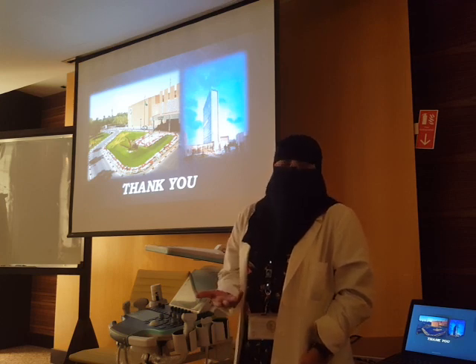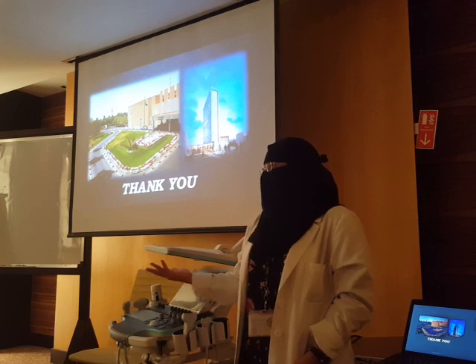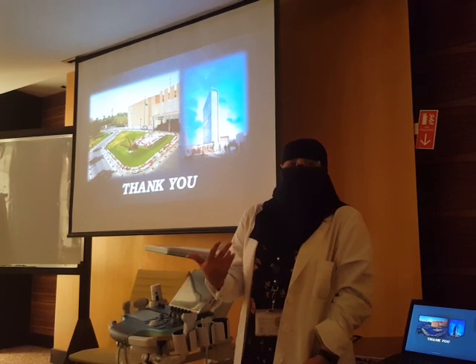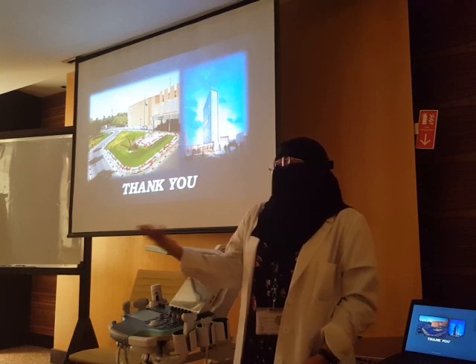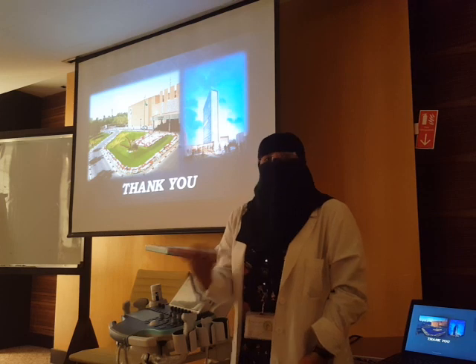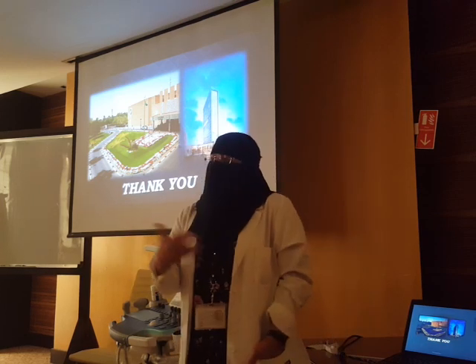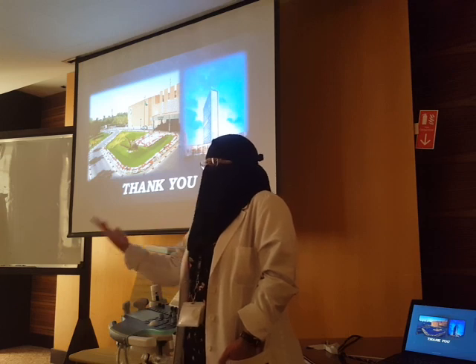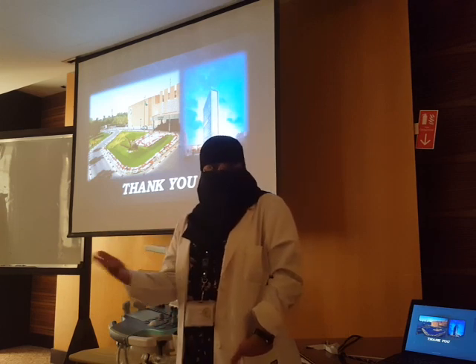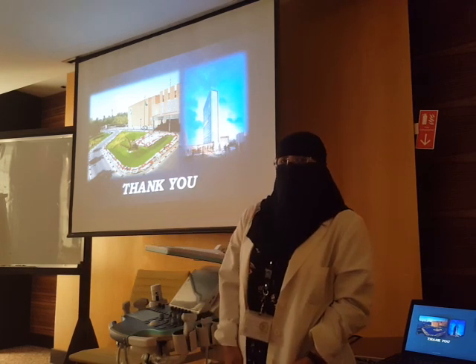If the adults are being evaluated for inflammation and the patient cannot go for CT because of contrast and renal failure, what will you do? You will get the maximum information you need. I will find there is a lymph node, there is free fluid, there is fat. It could suggest typhlitis. I am not making sure, my case is not 100%, but I have some information. One of three of the information proves it's pathological.